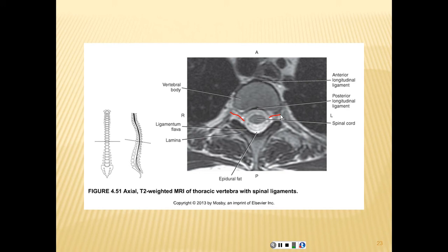Make sure you don't have too much tilt or rotation, so that the doctor can't see these exit points, because if the doctor can't see this exit point, then there's no way to tell for radiculopathy, because radiculopathy is actually compression of the nerve that's exiting this foramina. Spinal stenosis is when you impinge on the spinal cord, but when that nerve comes out and is impinged at this point, you now have radiculopathy.